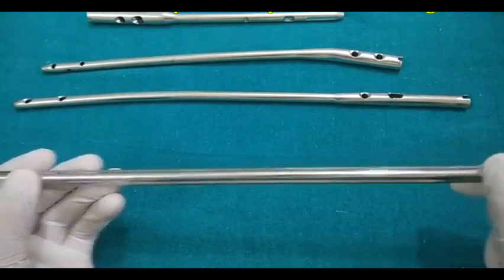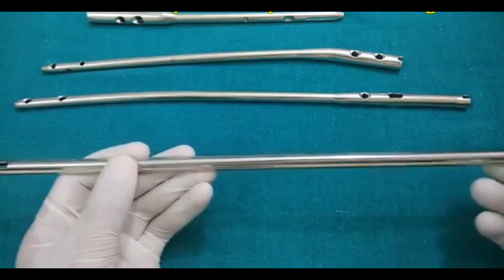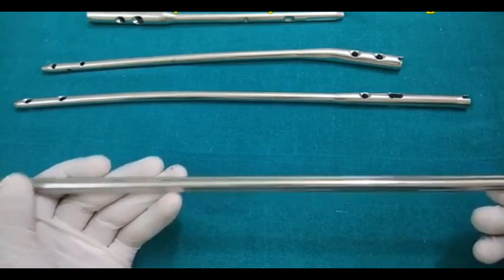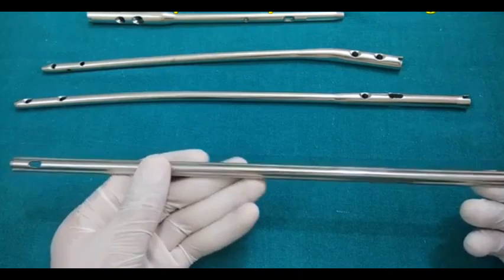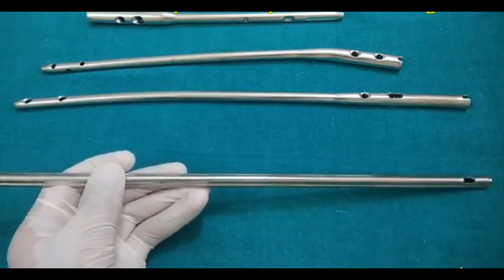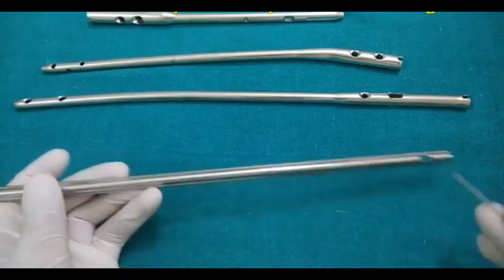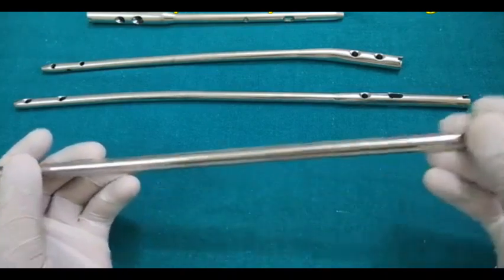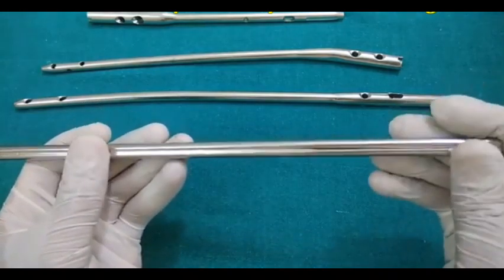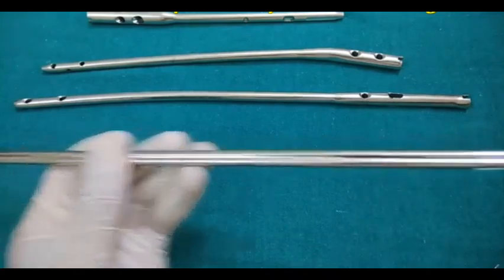Now, the second question is, why are there 2 eyes? There is one eye at this end and another eye at this end. The basic function of the eye is to remove the implant. It is used for the removal of the implant. So if you are inserting this nail, why are there 2 eyes? Again, the examiner will ask you why there are 2 eyes, one at this end and one at this end, because you are going to remove from one end. If this is the greater trochanteric end or the proximal end, and you are doing the implant removal, you just attach the hook over this eye and you will extract this.